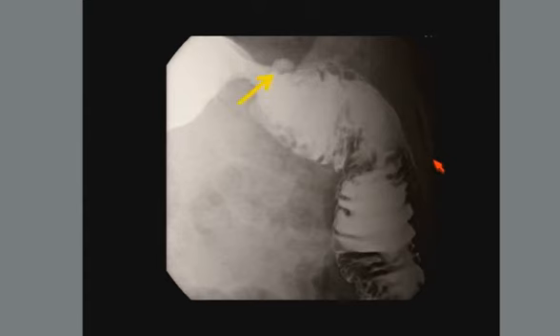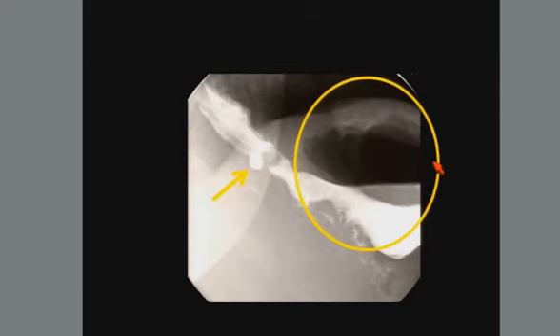Marginal ulcers are fairly common, and they're more often seen in patients who have too large of a pouch. They typically occur, as in this one, at the gastrojejunostomy. Another marginal ulcer here had an edema and a ball valve effect that was obstructing emptying of the blind limb of the pouch here.